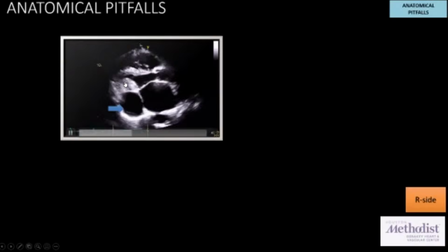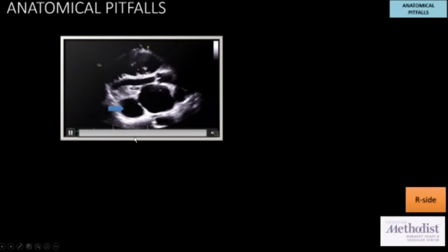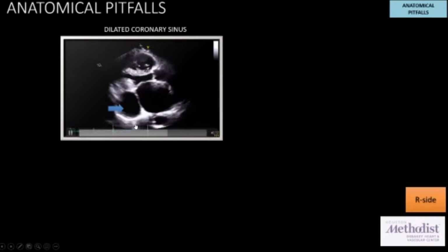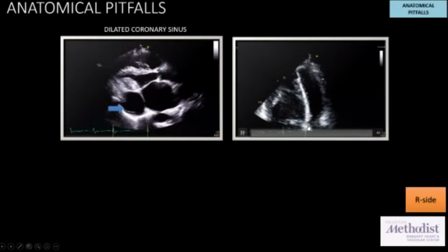Well, that's basically a dilated coronary sinus. It is usually seen in cases with persistent left-sided SVC or in patients with elevated RAP. And left-sided SVC, as you all know, can be confirmed with a bubble study using a left-sided vein. What do you think is this one?